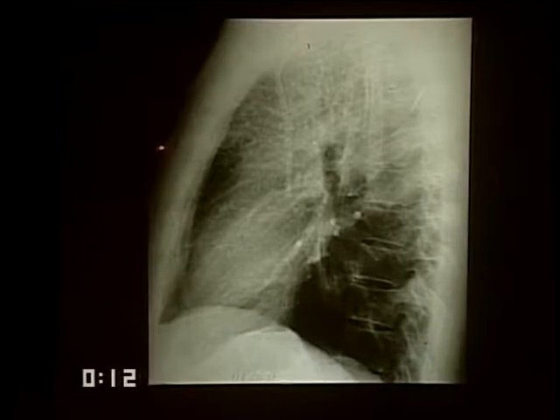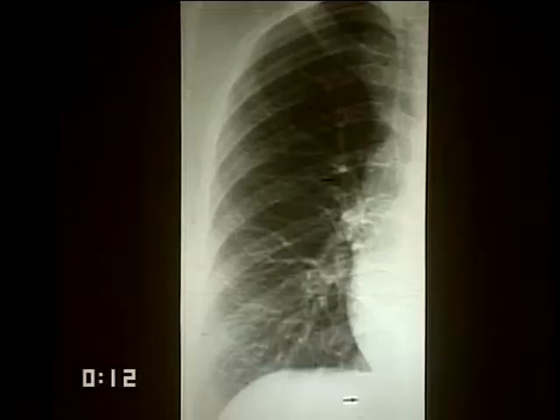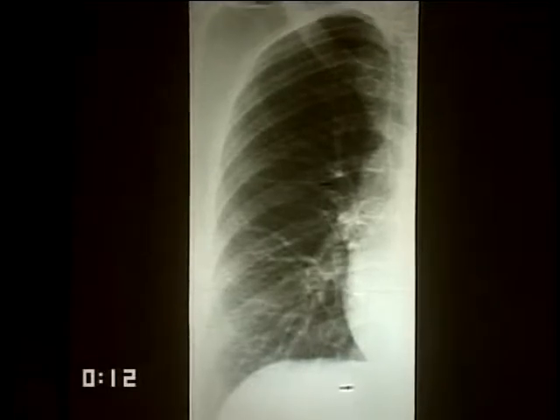One of the simple things one can do is look at the lateral. This is a rather obese individual. The plain film of the chest, the PA view, was confusing. When one looks at the lateral, it is perfectly obvious substernally that there is interstitial disease that should not be present in a normal individual. The lateral film can be absolutely critical in diagnosing interstitial diseases.